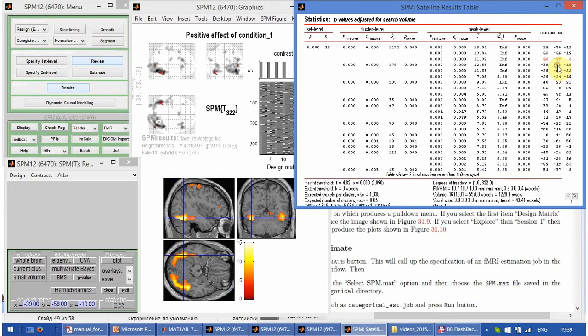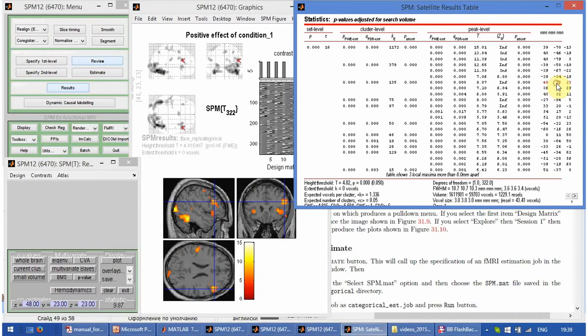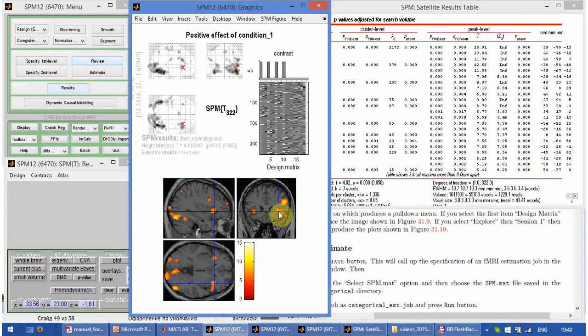You can see different clusters. This is on the left, the same brain area. This is something in the prefrontal cortex or premotor cortex, a bit of insula, everything absolutely significant. But at the moment it is simply an average response from all the conditions.